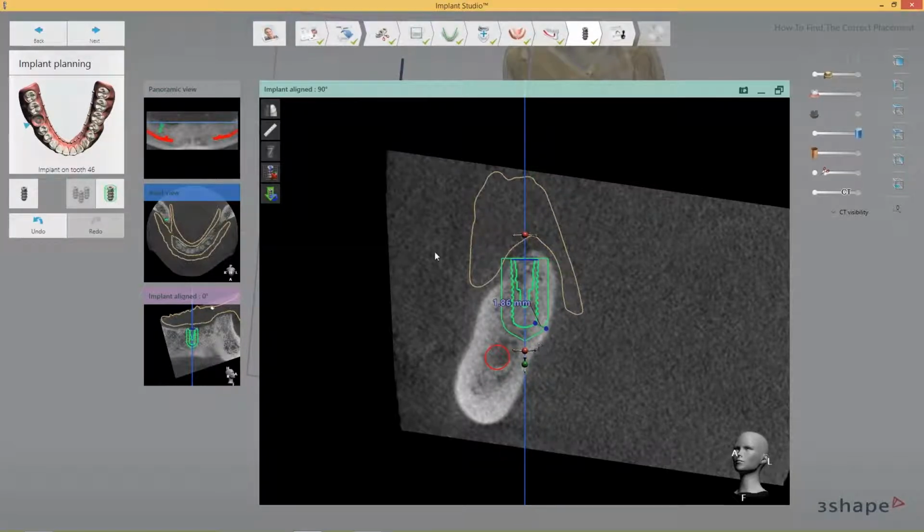Yeah, so that works. But it's a very good tool to quickly use the safety zone as a quick ruler, because it makes everything safe. So good.